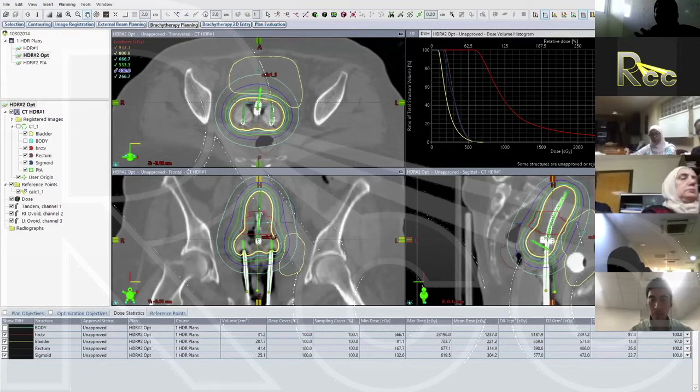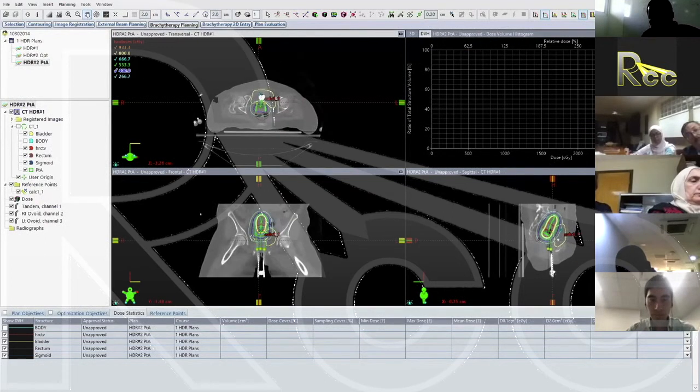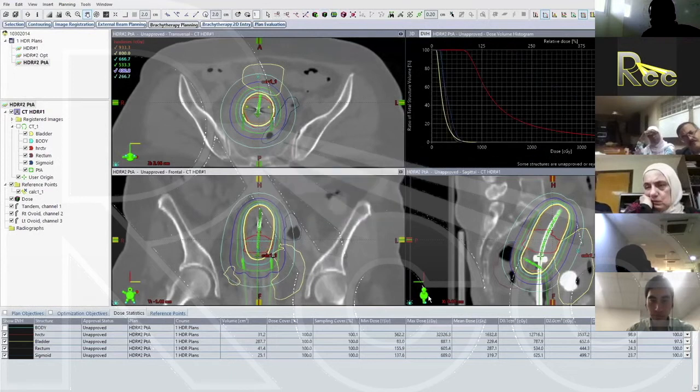So I have the first plan here just because this is one of our test patients. We've been using it for training purposes here. So we could just delete this plan. It would be perfectly acceptable to treat this plan, point A, because that is sort of a standard loading scheme, standard normalization. We would still want to look at all of the dose statistics for this plan. We would want to look at all of these numbers, but this is a perfectly acceptable plan.